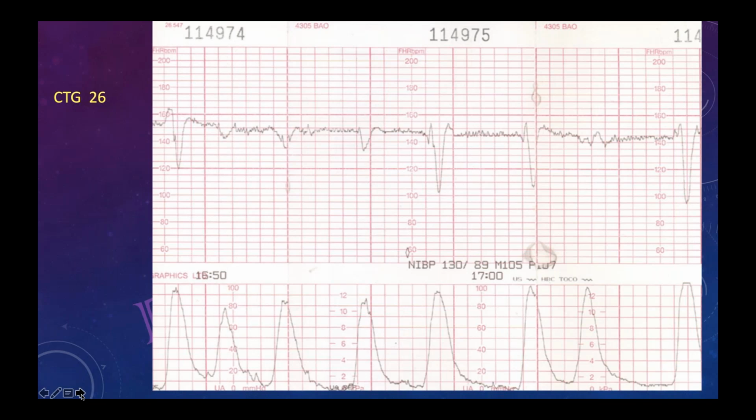So yeah, you are right, but actually this classification changed in 2017 to 30 minutes. Previously they used to comment on a 20-minute trace. So whatever traces we have got are for 20 minutes. Therefore, I was not able to get any 30-minute trace.